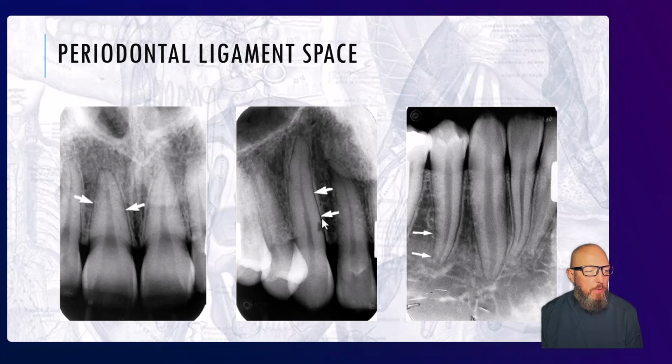It should be relatively thin and uniform, but you will notice that there's some variation, even looking at these radiographs. You see on this side of this tooth, it's fairly thick, but still within the range of normal variation, I would say. On the other side, it's relatively thin. Look at the lamina dura for comparison too. The lamina dura is a lot thicker over here, and it's thinner over there. Kind of invisible here. Does that mean there's pathology? Not always. Just get used to the fact that there's going to be some degree of variation, even within the same patient as you look through these.